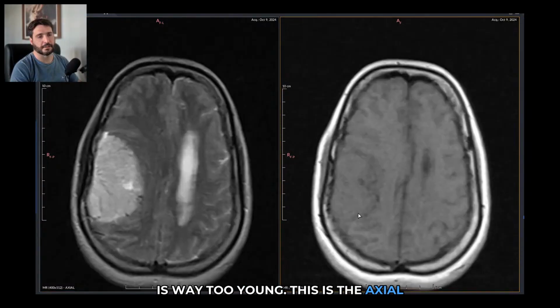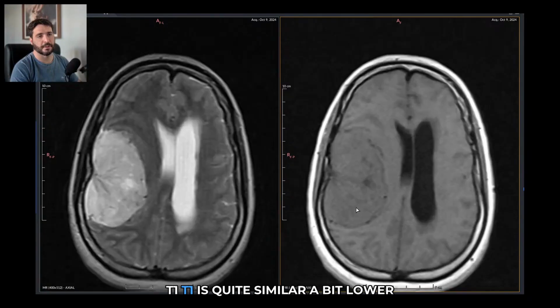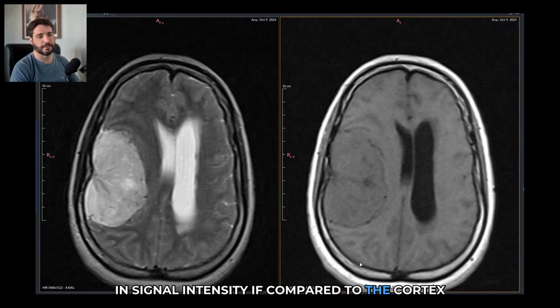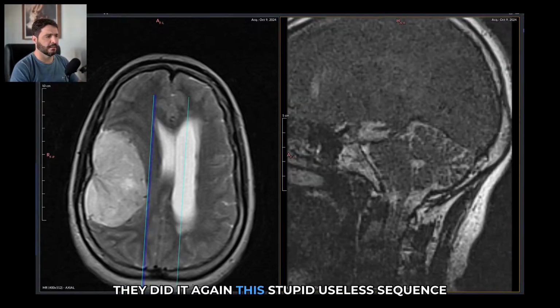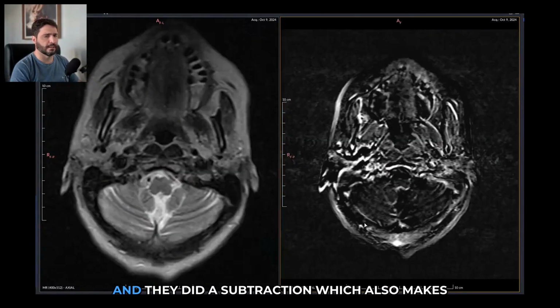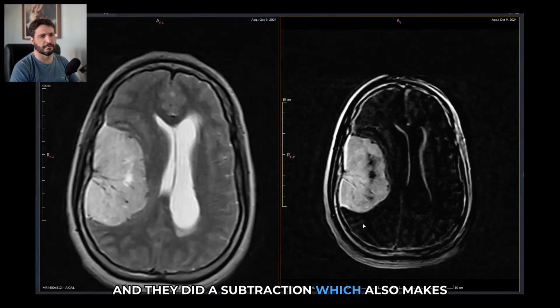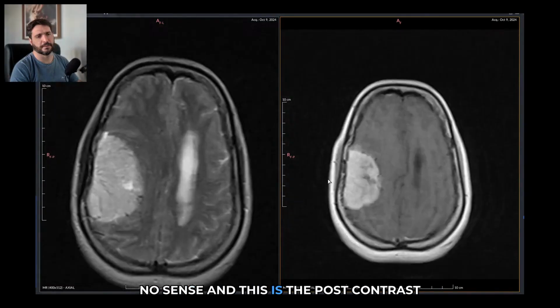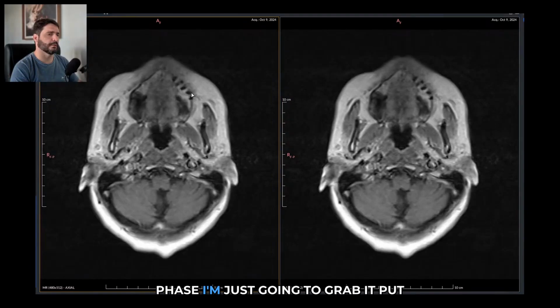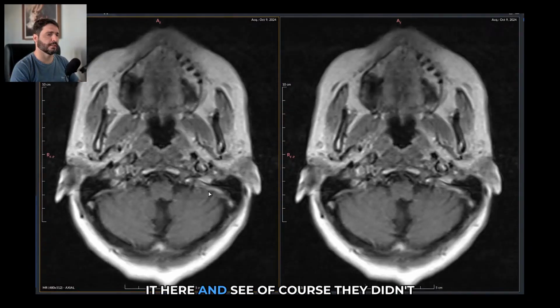This is an axial T1. T1 is quite similar, a bit lower in signal intensity compared to the cortex. They did it again, this stupid useless sequence, and they did a subtraction, which also makes no sense. And this is the post-contrast phase. I'm just going to grab it, put it here and see.